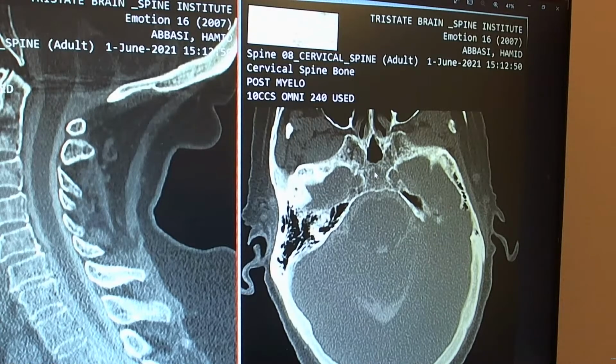And this area here, who can tell me what that is? These are the muscles. Woohoo! No, this is not the woohoo muscle. This is the masseters. Perfect. Excellent. Wow. We have a strong team today. Let's go to this picture here now. This area here is a part of the brain. What is it called, this area of the brain?